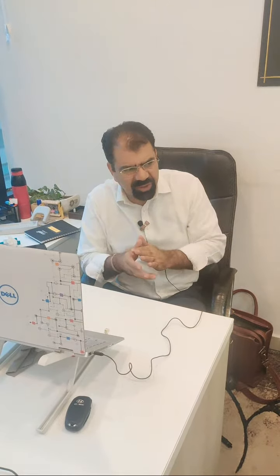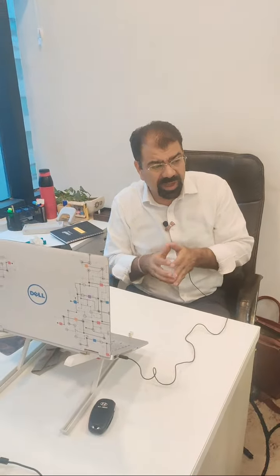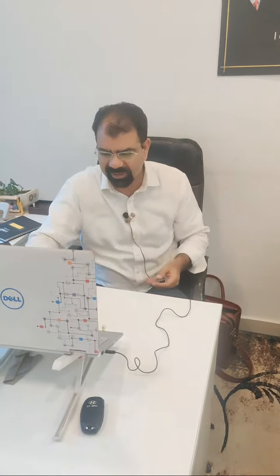The point here is that if you keep this checklist in your mind, most of the times you will get something from an infertility scan. Don't always look at the follicles only.